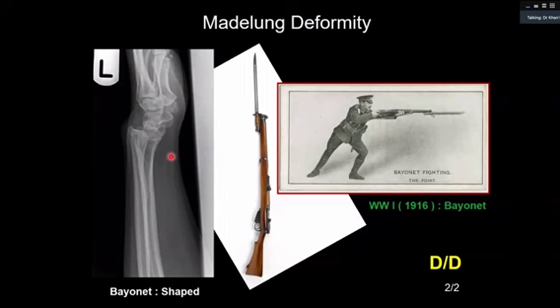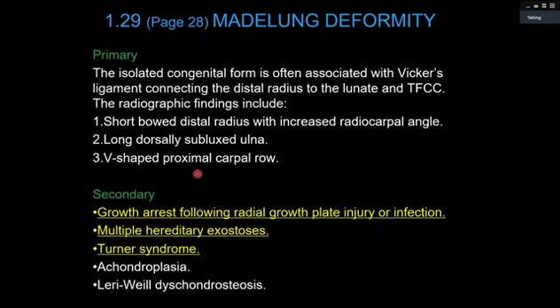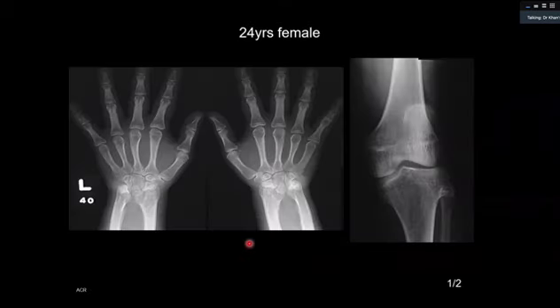There is a bit of differential diagnosis. And you did mention other things in your description. You were ruling out things, and you did well where you ruled out also Turner syndrome. Now, Turner syndrome, if you see this case, candidate 2, this is Turner syndrome. Can you describe and tell me why it is Turner syndrome?